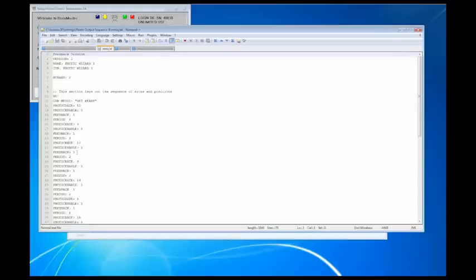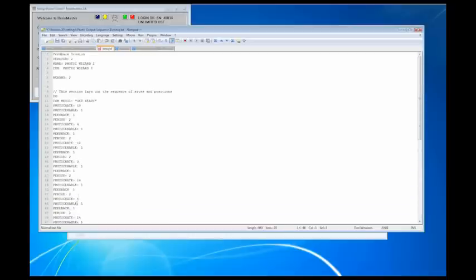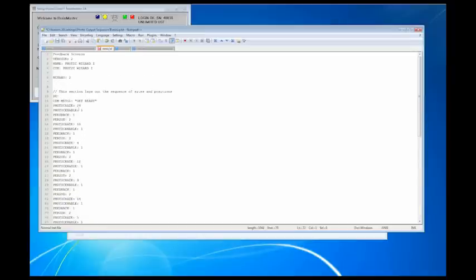The problem with doing it this way, let's say you wanted to change things. Well, you're going to have to go through, and let's just say I wanted 24 to be up here, so now I'm going to have to cut this, Control X, and I want to start it up here, so I hit enter, and I paste. Okay, that's not too difficult, but it's one of the things you're going to have to do. Another option, and this is what I do recommend for a lot of people who are going to be doing different cycles, is to create a cycle.